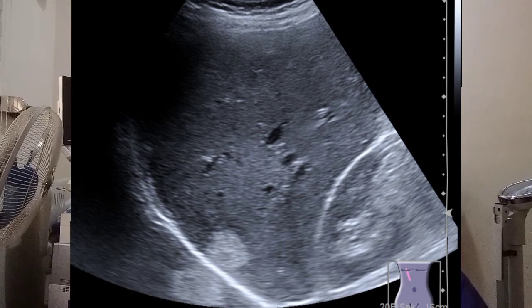So to help determine whether this lesion is real or not, the following factors can be considered. Mirror images are created equidistant from and on the opposite side of the diaphragm from the real echo or lesion. This artifact can be minimized by decreasing the overall gain. The mirror image will be a replica of the infradiaphragmatic lesion.